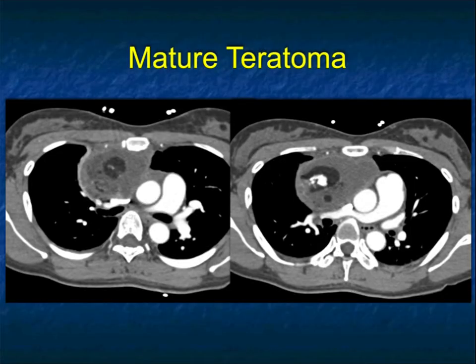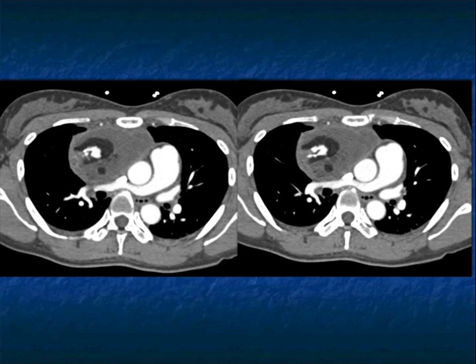Now, amongst those T's, anterior mediastinal mass, cystic lesion, fat, and calcification. This is the most classic teratoma you're going to see. Teratomas are often detected in younger patients, but we can see them in older patients. They can be small or, particularly in pediatric patients, very large and presenting with mass effect and even shortness of breath. But just a beautiful example.